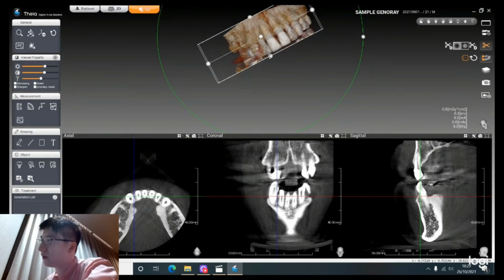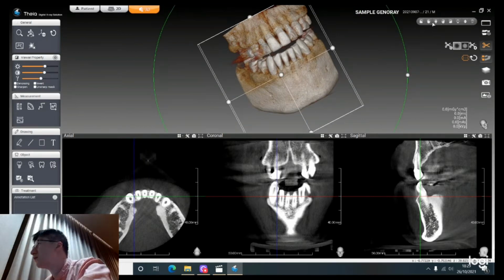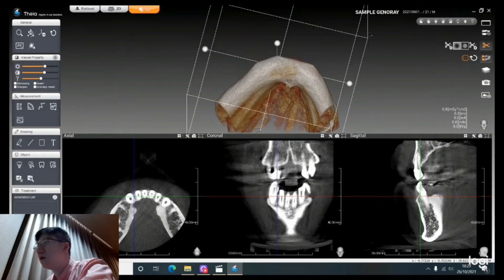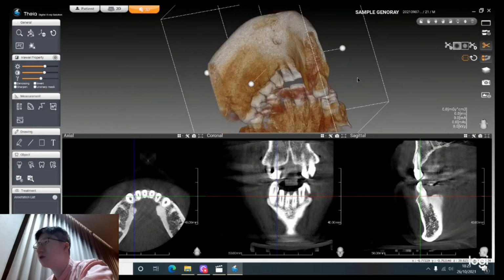Give me a sec there. See, the pictures get a bit difficult to deal with if you are not used to it. Anyway, see, now I can't see the bite because it's being obstructed by the bottom view.